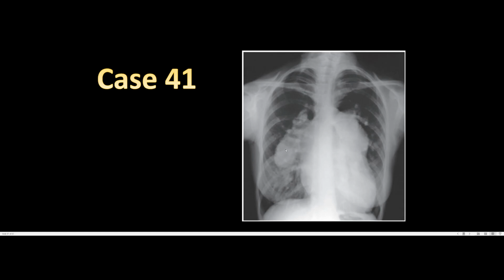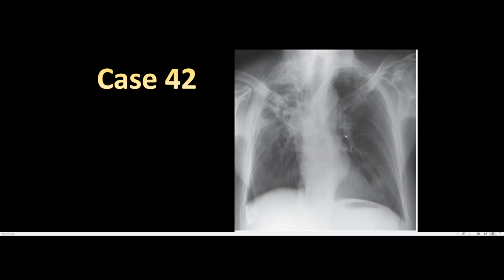So this suggests to me, especially if you have a patient history and examination, especially if we have a loud S2, for example, that this is a case of bilateral pulmonary arterial hypertension. It can be idiopathic, it can be due to COPD, it can be through a whole number of things. But this is a case of pulmonary hypertension, all right? Very obvious. Now, if we look at this case, this is the same or a very similar case to what we mentioned before about bronchiectasis and interstitial lung disease. So again, this is a spot diagnosis.